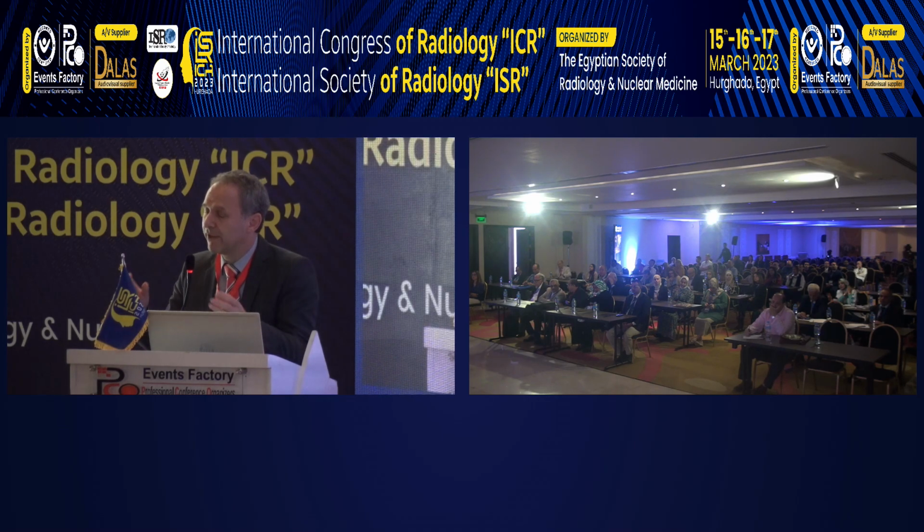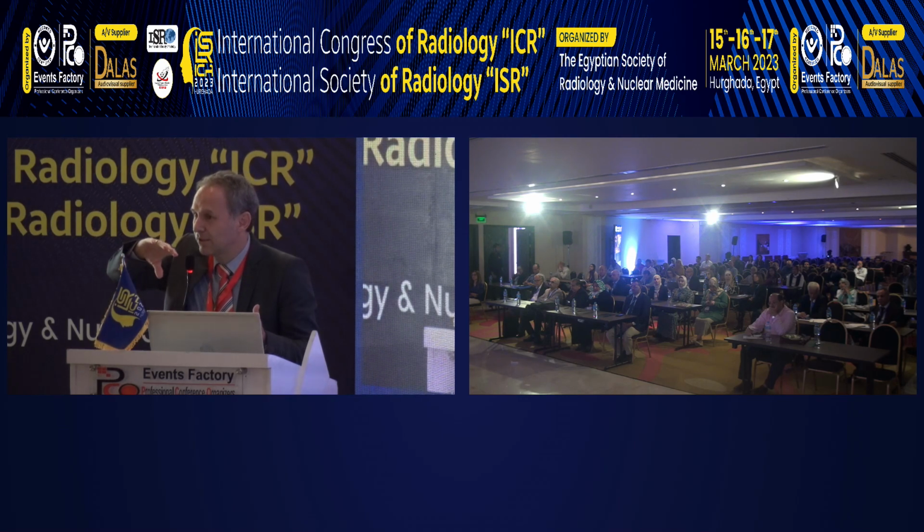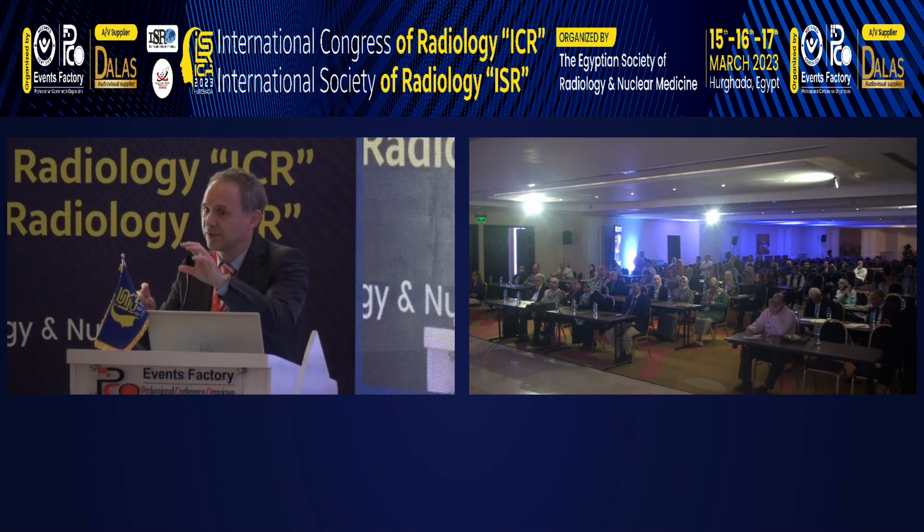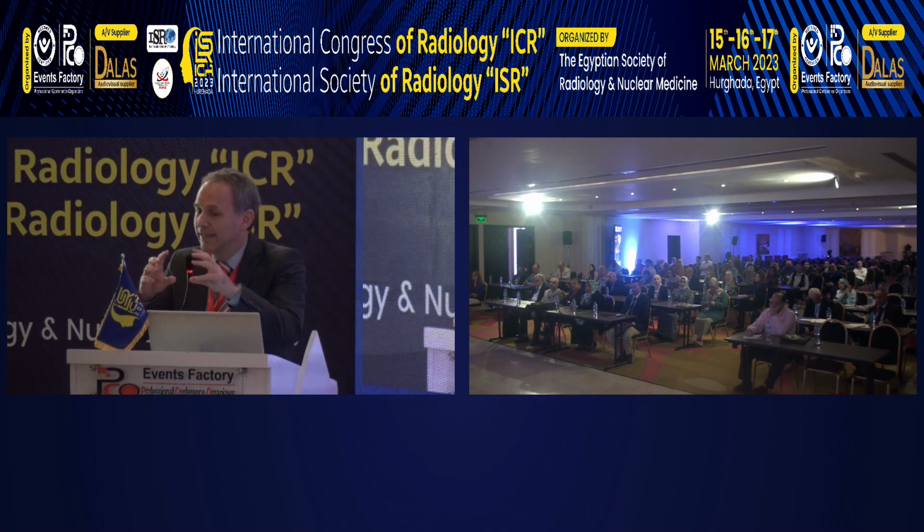If you don't find that, then it's the topographical location. Let's take that last example of posteromedial impingement. If you find in your axials, and I think contrast is really helpful, this sharp demarcation and the typical localization, then you're maybe happy to suggest it could be. And the same is true for the other locations. This is why I highlighted in green our target areas. In those target areas, anterior, anterolateral, for example, you would need to see those findings in order to suggest it.